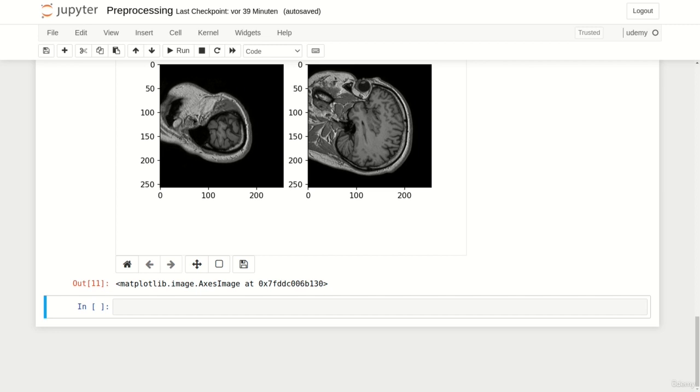Now it's time to take a look at the calculations we need to transform coordinates between the two coordinate systems. At first, we have to define our voxel coordinates which we want to transform into the physical world. To do so, we can create a NumPy array containing a list or a tuple with the coordinates. As an example, let's simply say we want to compute the coordinates of the offset 0, 0, 0. Additionally, for convenience, you add the 1.